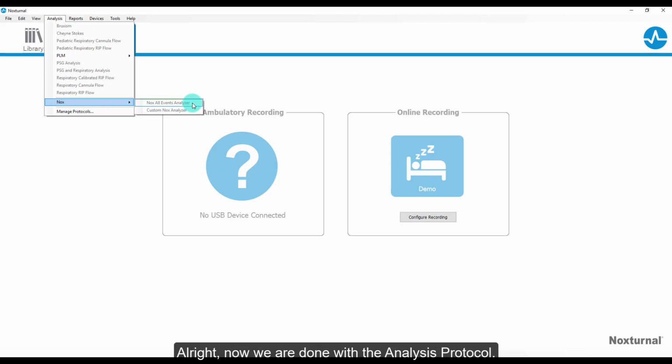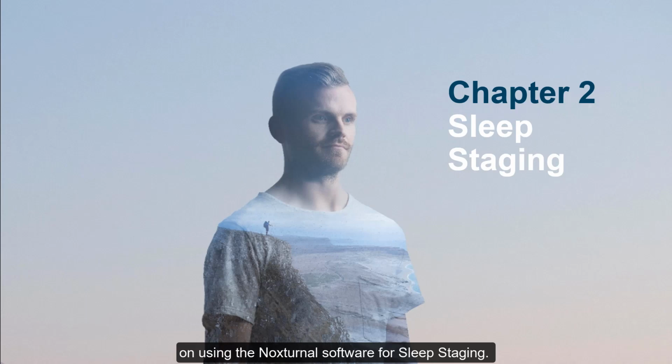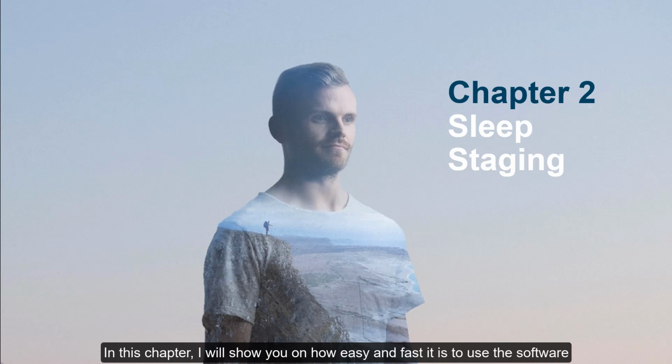All right. Now we are done with the analysis protocol. Now we are moving on to chapter 2 on using the Noxturnal software for sleep staging. In this chapter, I will show you how easy and fast it is to use the software.